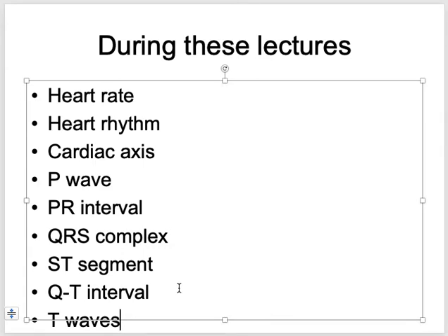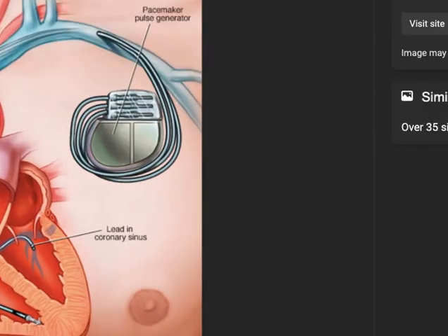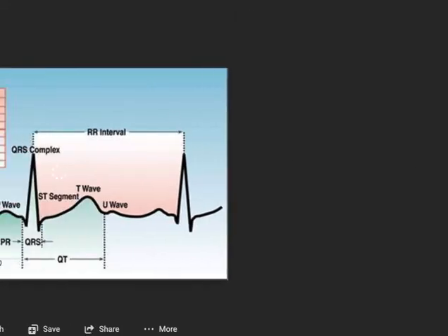Now, just to tell you guys a little more about the waveforms. One of the things which I think came during one of the slides, they were showing you U waves, right? So now, U wave, again, I will show you how U waves look. PQRST one thing is simple. So remember, it comes after the T wave. So I will show you again the U wave on ECG. See, this is PQRST and then again a U. So it appears this way: PQRST and then U, right?